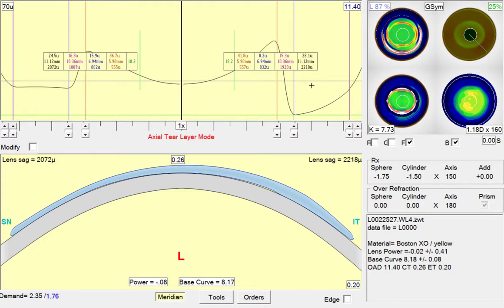And if we bring up the display, then we can see we're pretty close to target. One click bumps it 2 microns in this particular scenario, so we'll just go with 1923, 832 in the blue. And we can make the opposite change in the opposite meridian.